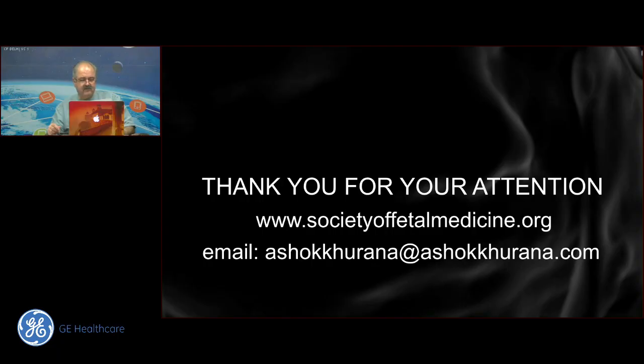Then we have to differentiate between multicystic kidneys and polycystic kidney disease. Polycystic kidney usually has echogenic small cysts that you can't see as individual cysts. Multicystic is larger cysts, vast majority of them more than 2 to 4 millimeters, and sometimes up to 12 and 14 and 16 and 25 millimeters. And then of course typically the polycystic kidney disease is bilateral diffuse large kidneys. The multicystic is either one whole kidney or part of a kidney, rarely both kidneys, but again very large.